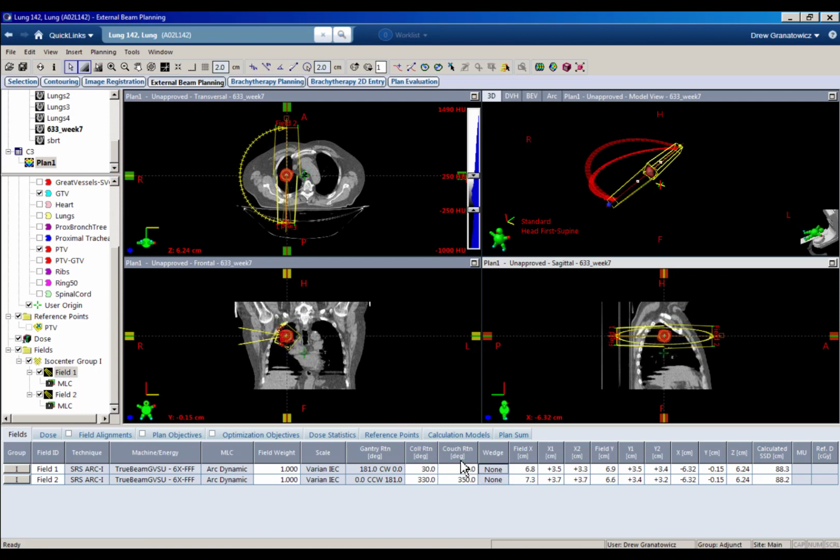The angle that's rotating up towards the arm there, I might do 353, maybe 7 degrees or something like that. 10 degrees works, I'd say, 90% of the time. But occasionally when I do these plans, I do have some arm issues. So just to be safe, if I'm in the upper half of that lung, I'm going to only do 7 degrees towards that lung.